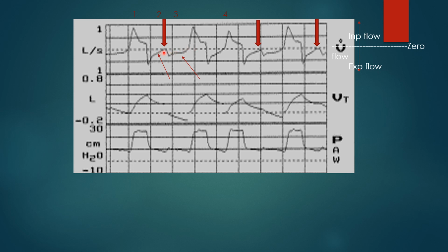This right here was an inspiratory effort, but the patient was unable to create any inspiratory flow or drop the pressure, and so he did not trigger a breath. We look at our volume curve, we see the volume that went in is about 400, and then he exhales 200. He makes that inspiratory effort, and then he exhales 200 more.